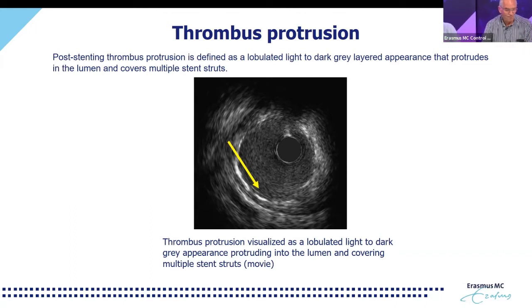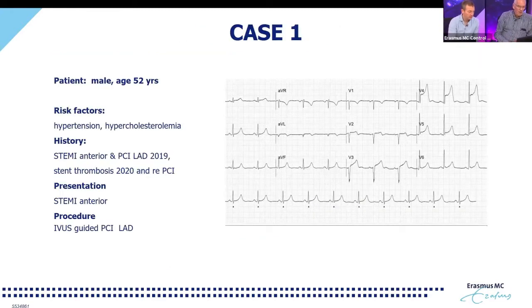Yep. Jurgen, thanks for that. We hope that this already provided you with a little bit of background on how to recognize the different types of thrombus, but we thought it would be good to show you that based on some case examples we've encountered in our routine practice in the past year.